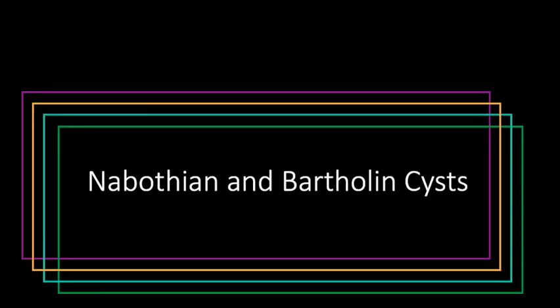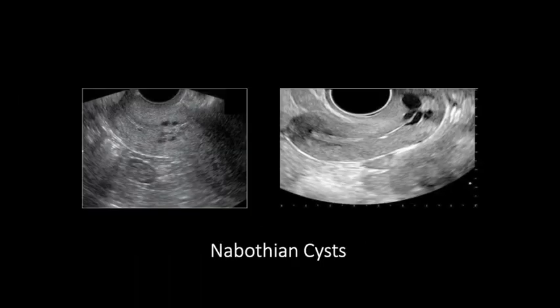Let's next turn to a couple common cystic structures seen in women, especially in premenopause. These images, which I took from Cambridge University and Drs. Turan, Bahat, and Seton, show 2 views of a round, small, anechoic collection on the cervix. These represent nabothian cysts, a common and benign finding that could be mistaken for a gestational sac or for free pelvic fluid if not fully examined.